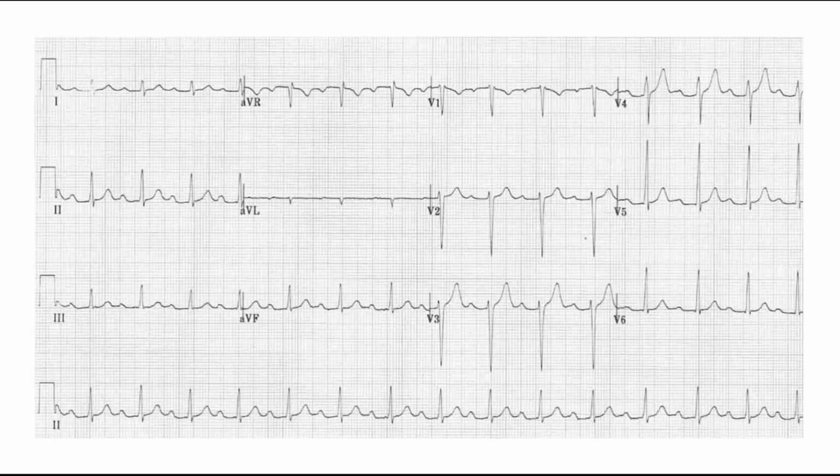So, for example, here you have these long PR intervals. What I like to do is find a P wave that starts somewhat on a large box line and see if that's larger than one large box, then I'm looking at that prolonged PR interval.